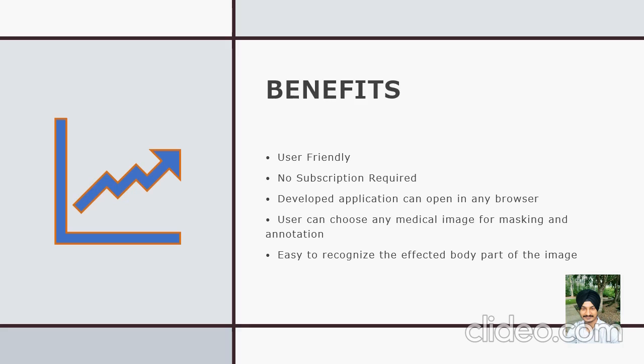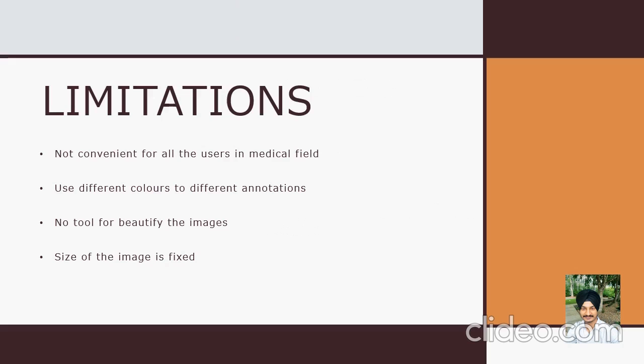Moreover, this application opens in any browser like Google Chrome and Internet Explorer. User can select any medical image for annotation. So this application makes it easy for the user to recognize the affected areas of medical image by annotating those images.